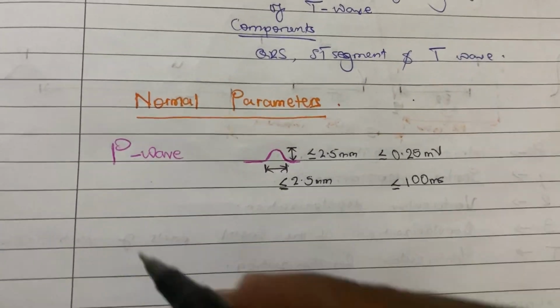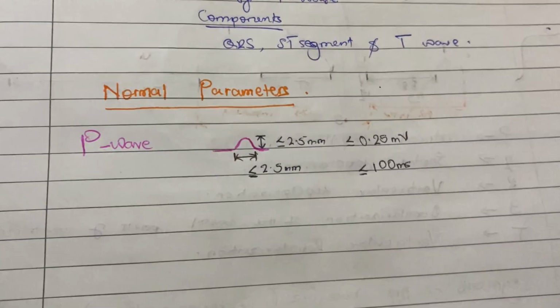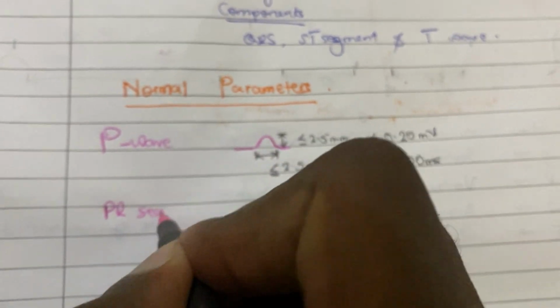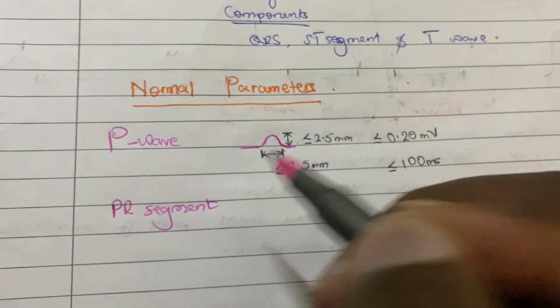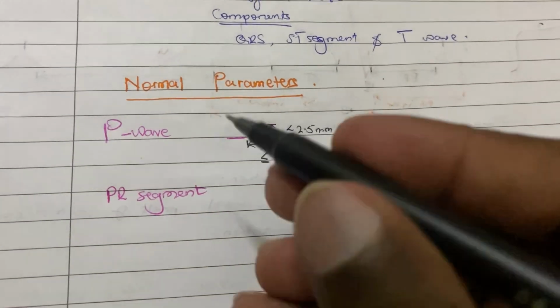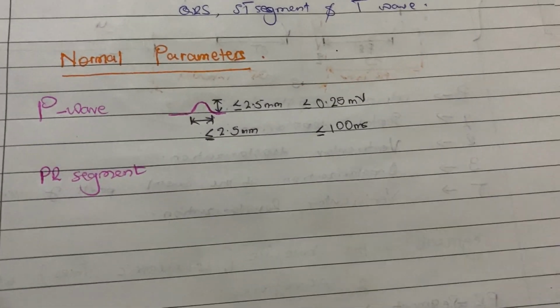The next is the PR segment. The PR segment is just a straight line or a baseline.